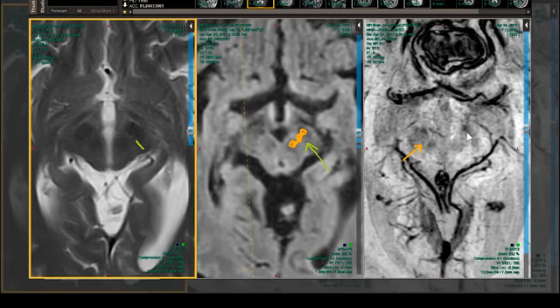But if he's in the wrong place, hemorrhage is the same way. Dr. Pomerantz was talking about hypertensive hemorrhage of the brainstem, dentate, basal ganglia. Where is it? Is it near the sylvian fissure? Could it be an aneurysm rupturing into the parenchyma? So location of these things, when you see these findings, if you start thinking like the surgeons do, it's going to be really important to help you come up with an etiology for these things and appropriate treatment. And we're going to get into that as we get into spine and everything.